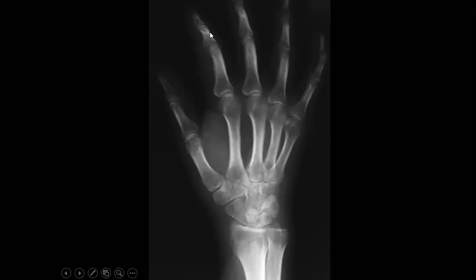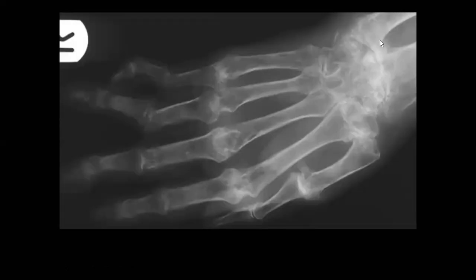This case, yeah, when you find this osteopenia, you will go to check the articular sites and check if there is any type of arthritis, right? So you will check the common sites of arthritis and try to differentiate between the types of arthritis. And the top of them will be rheumatoid, sure. So for another patient, you'll find, for example, this appearance, which includes the carpal bones and even the distal radius and ulna.